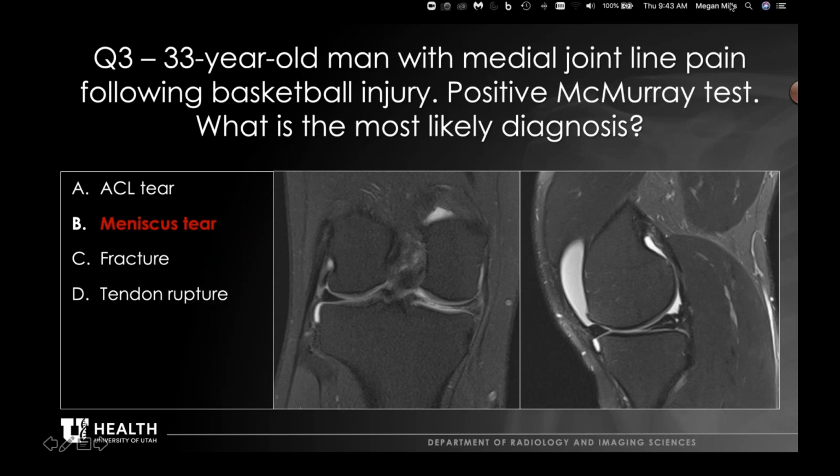And do you have increased fluid in the anterior joint space? Yes. So this is a joint effusion. Joint effusions are very common in the setting of any joint abnormality, whether that's arthritis, a ligament tear, or a meniscus tear. The body responds by sending inflammatory markers to help the body heal, and that often results in a joint effusion. We have quite a bit of joint fluid in this case, and it surrounds all of these recesses. There's a little bit of joint fluid here as well. Awesome, thank you.